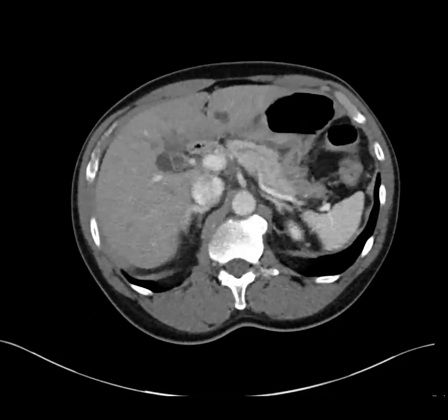But in the end, this patient ended up going to the OR. This was actually all ischemic terminal ileum and colon. And then we got a follow-up MR, and the SMV was completely open. So there wasn't actually a thrombus. It was just a mixing artifact in the SMV. But for some unknown reason, there was ischemia of the terminal ileum and colon that ended up leading to an intussusception. They underwent a right hemicolectomy, so now the rest of the colon is normal here.